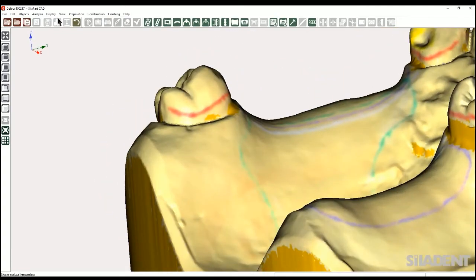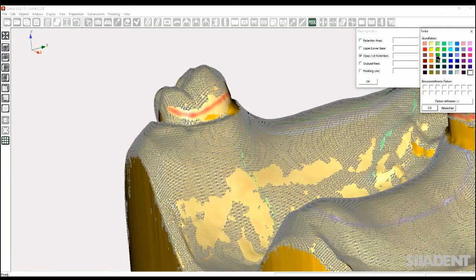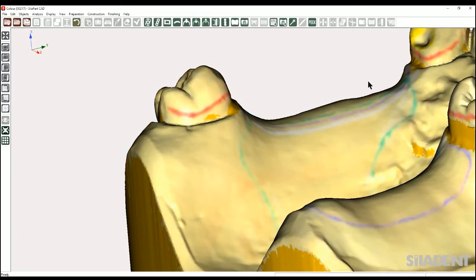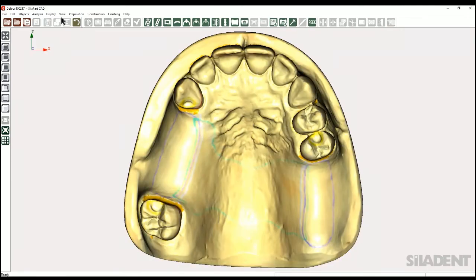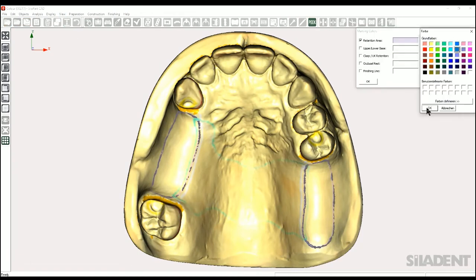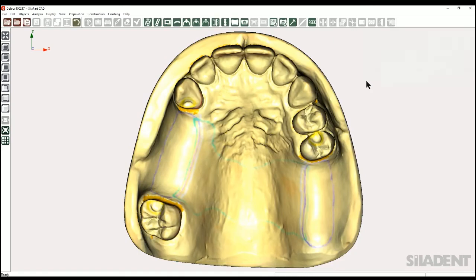Even more convenient is designing with a fully automatic function. For this step, it is necessary to define fixed colors for the design groups. In an easy procedure, we can calibrate the SilaPart software to the colors we use on the model. If we have fixed the colors, the software creates all elements for a color group automatically in one step. We use the wizard tool for this function.